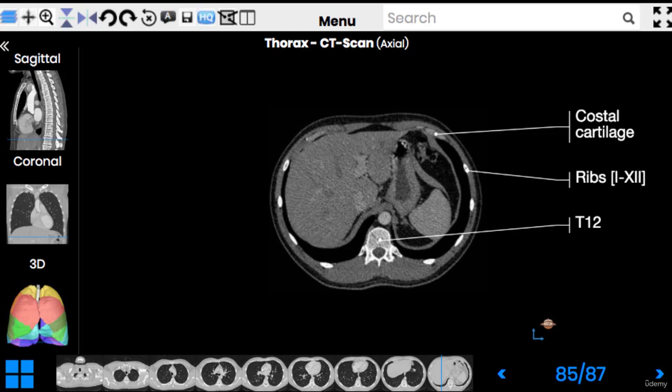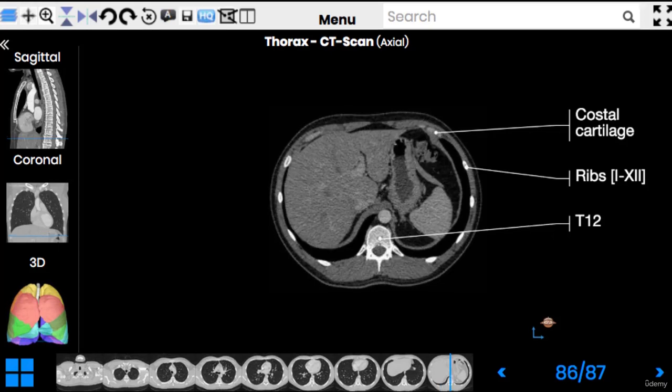The radiolucent area just behind and lateral to the diaphragm, this split here, is the costodiaphragmatic recess, the kind of empty space between two pleurae. So in our deep inspiration, the lowest parts of the lungs enter this recess and may be found here.